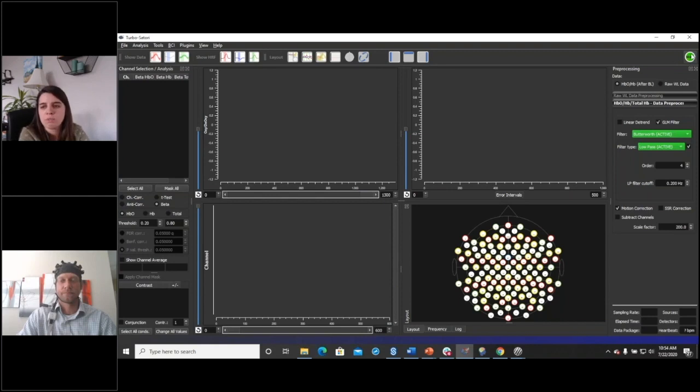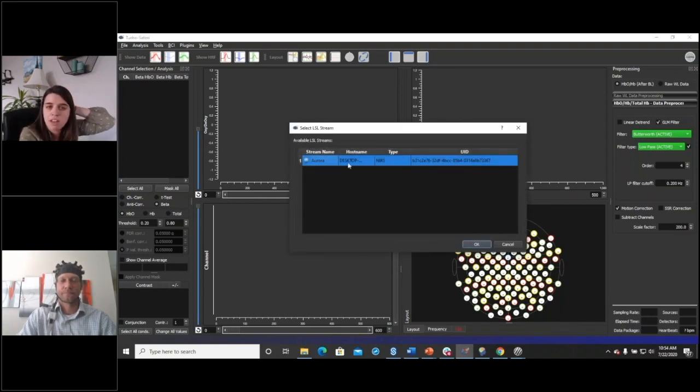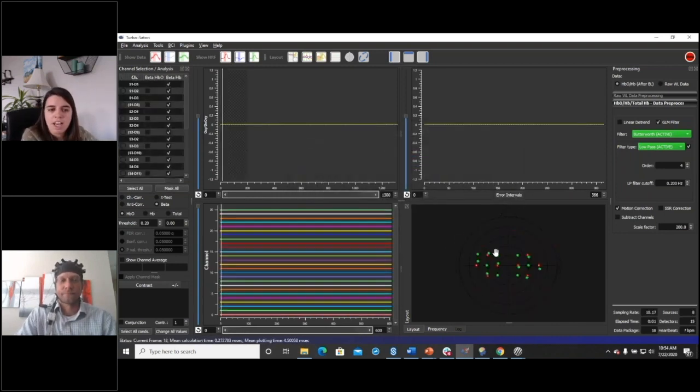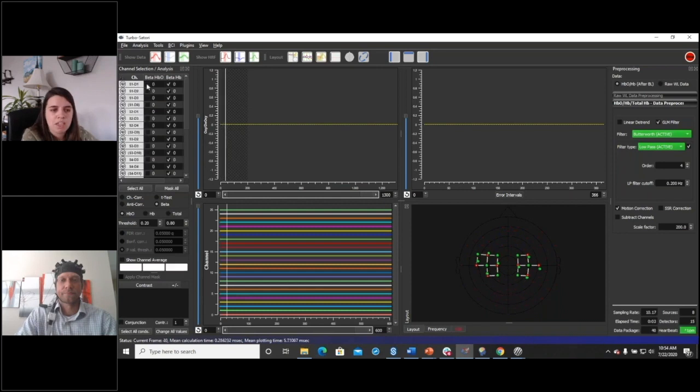Okay, so just like before, I'm going to use the start button, but here I'll be prompted for an LSL stream rather than an old data file. So I'm going to click OK. And now we have our data streaming in.